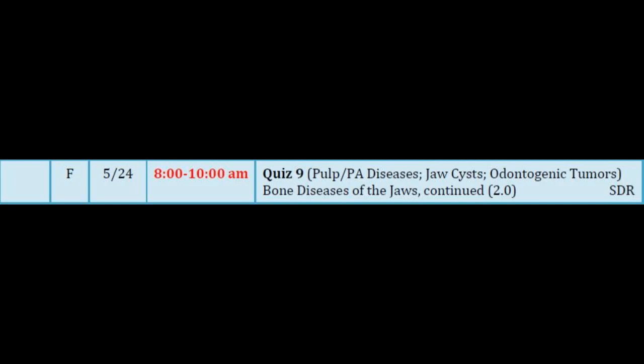Here's another one. This was a patient here at the school that we followed over time. Top radiograph is at age 39. That's a 39-year-old black female. And that's in the mixed stage, where we have some opacity in the center and some radiolucency around it, and there are multiple lesions. And then when she was 45, see how the opacity is more uniform and distinct and larger, but there's still a radiolucent rim around it. It's matured very nicely. And both of those are very, very characteristic, very, very diagnostic for this condition.